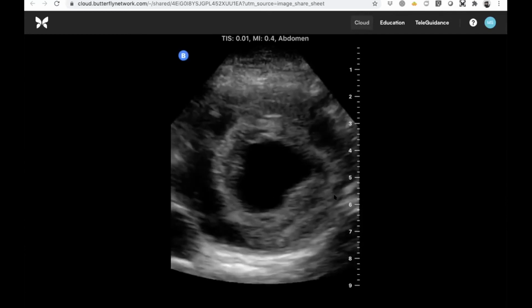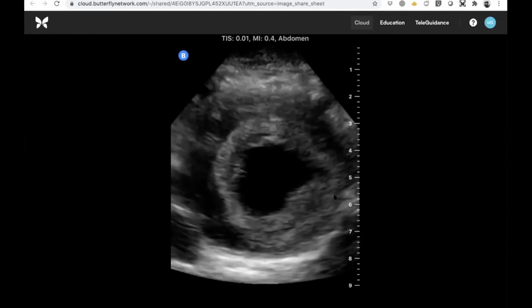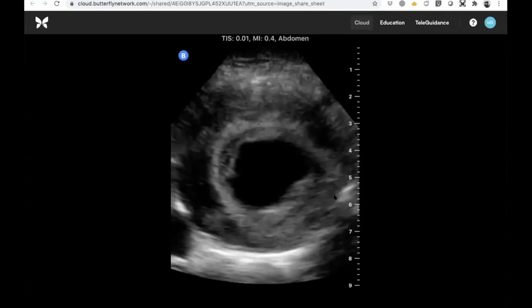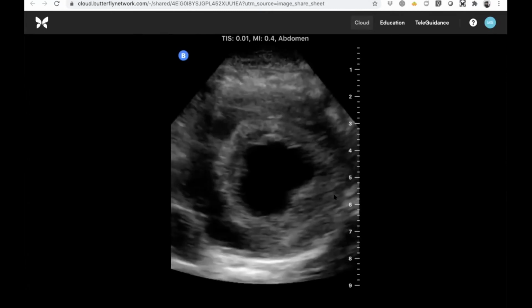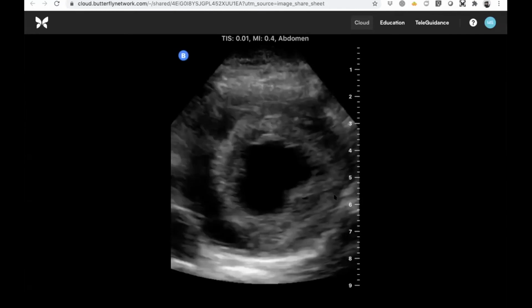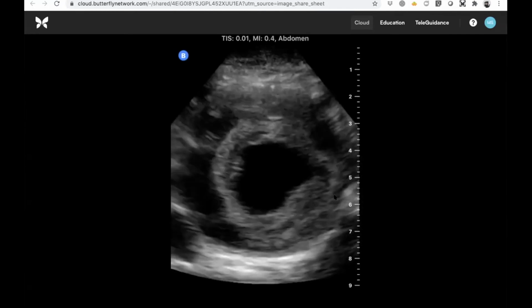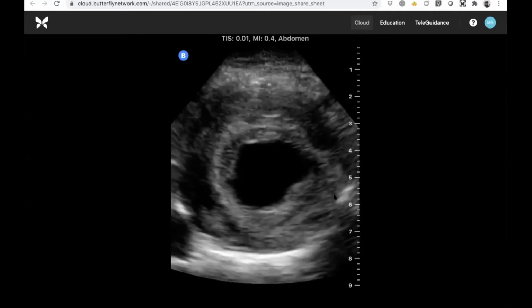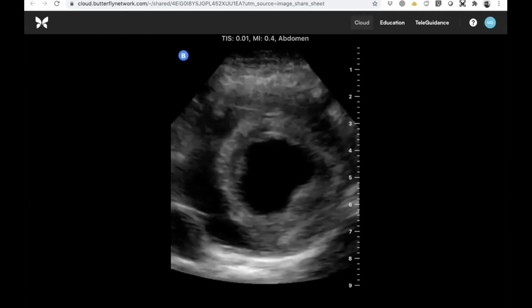And you might gain some additional useful information by putting color on. So that's a great tip, and agree with you, Al. That's a good idea. I think it's safe to say, like in anything that we do, two orthogonal planes or two views at least is probably necessary. Just to make that point that, even though we are isolating these images just for the purposes of image review, in most cases, the scans that get submitted have many views, 5, 6, 7, or at least 2.